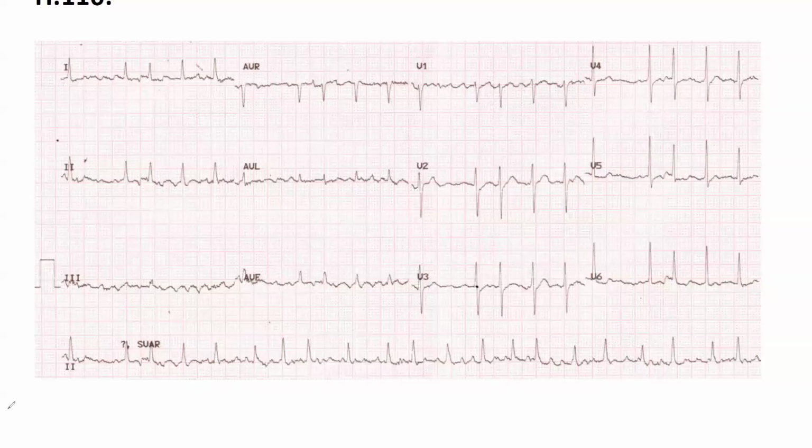As you see, you don't need to count right now because it's difficult, especially on your monitor, and you do have tachycardia. That's tachycardic for sure. You can see that the distance between the two R's is mostly 2 or maybe 3 or less than 3. So that's tachycardic for sure.